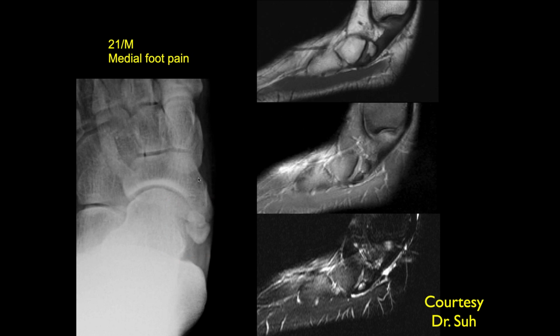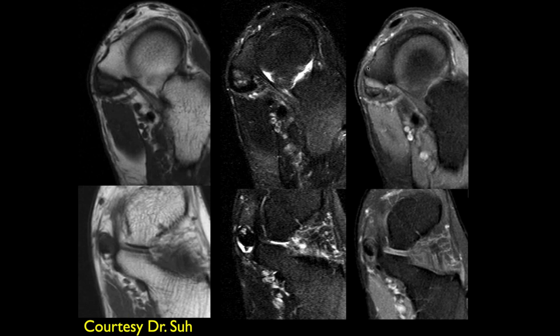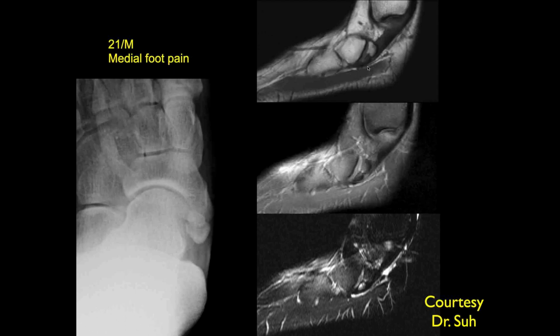All right, so I think this is a 21-year-old male with medial foot pain. We can see almost a bipartite type 2 in the os navicular. I don't know if it's fractured before, but one of the parts is quite edematous on the inferior, the plantar aspect. So I'd be worried about a painful os navicular syndrome here. I don't think that this is an old fracture, do you? Yeah, I mean, I think it might be, especially the fact that the type 2 os navicular looks fractured, but it's well corticated. It could be an old fracture plus edema of that.